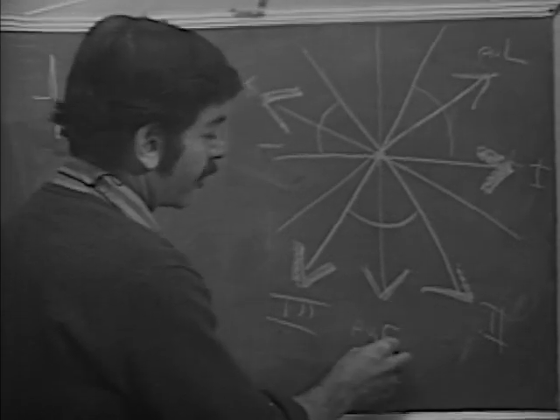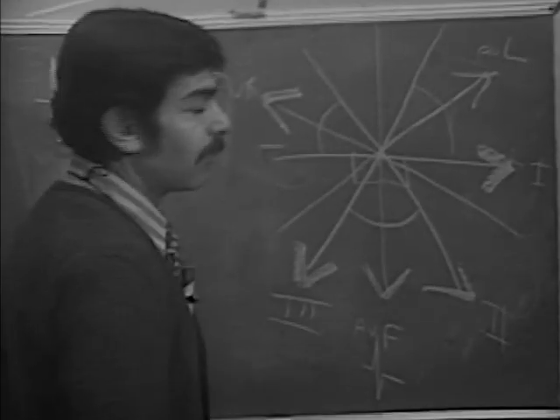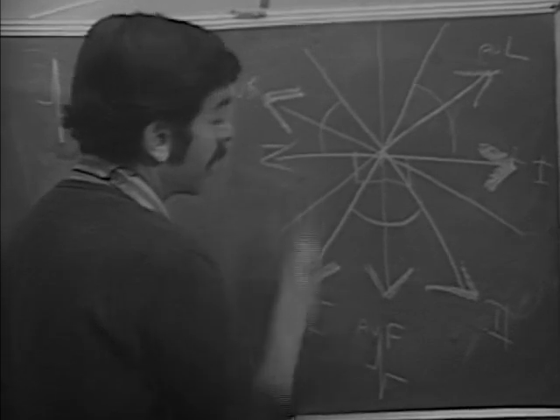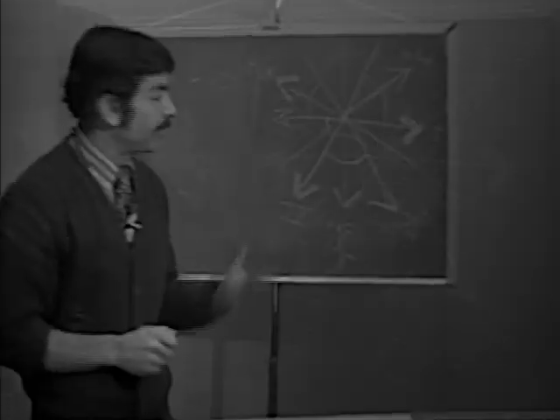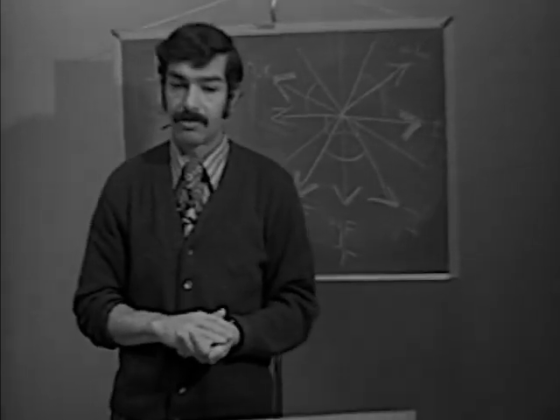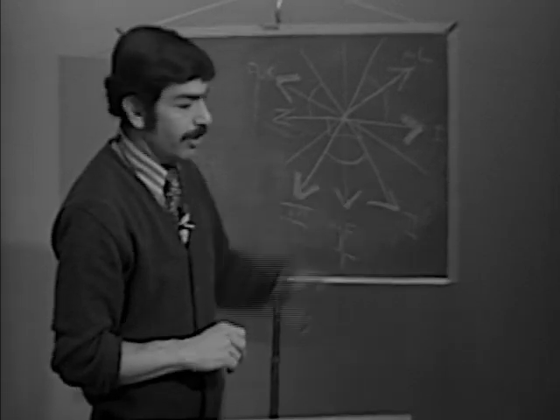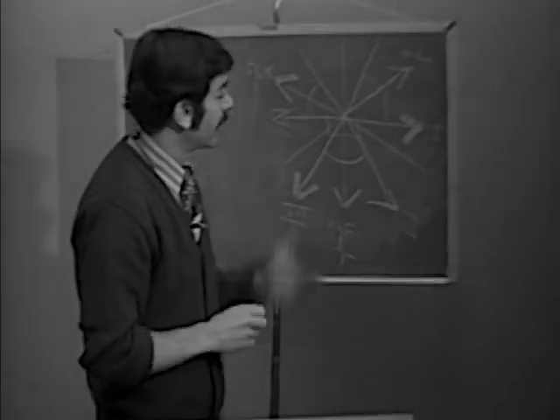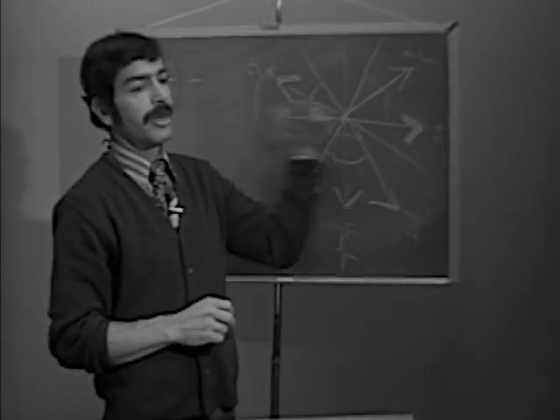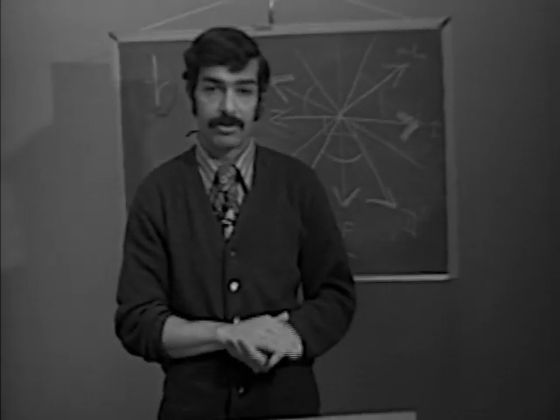So what's at right angles to AVF? Lead 1 is at right angles to AVF, right? And we could be going this way or we could be going this way. The axis could be going either directly out to the left or directly out to the right. We don't know which. So we found our isoelectric lead, and then we say to ourselves, well, the mean axis is either going towards lead 1 or it's going 180 degrees away from lead 1. So we've narrowed it down to two possibilities.